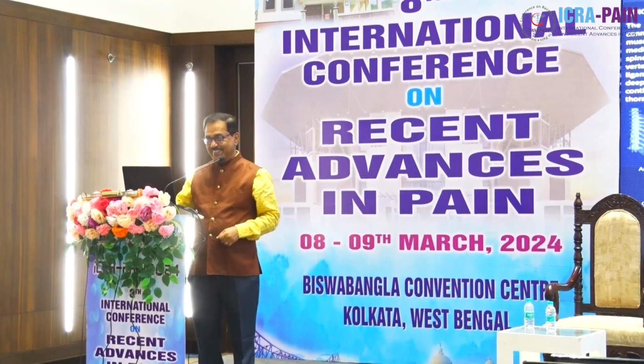So this is our plan for this session right now. Okay, let us start. Let us start with the 3D anatomy first. Okay, so most of you understand this. I'll be asking questions, so you have to answer.